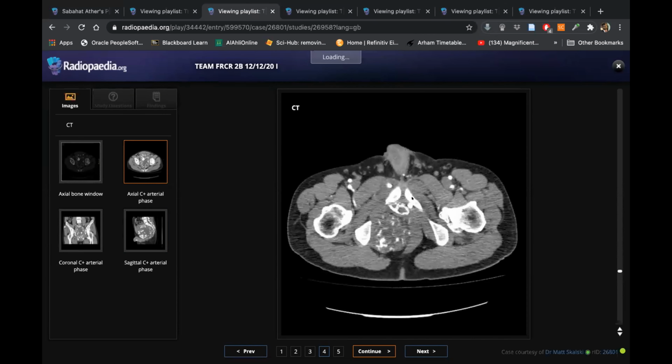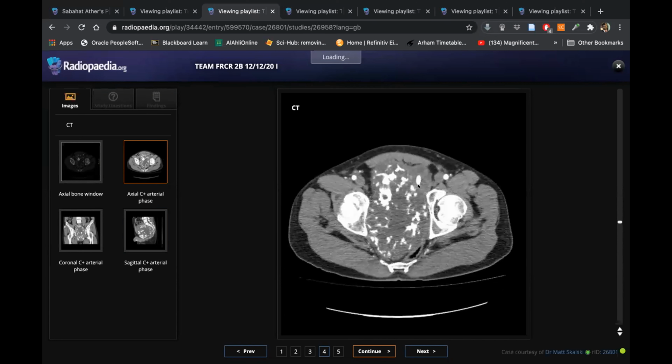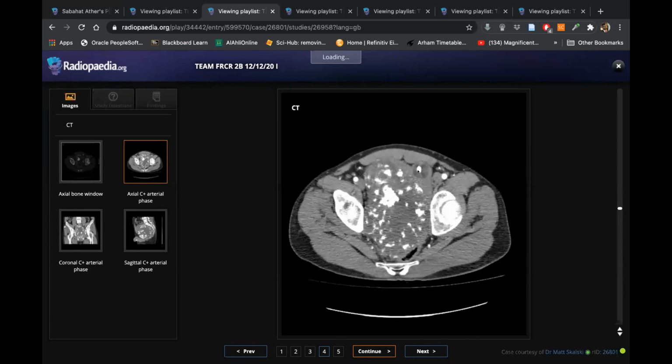There is a catheter, right? Yes. Sorry, it's the prostate, I think. Because I'm not able to see the bladder separately, I initially thought it's a bladder tumor, but it can be the prostate also, going by the anatomical location. In that case, you have to think of metastasis with a prostatic primary.